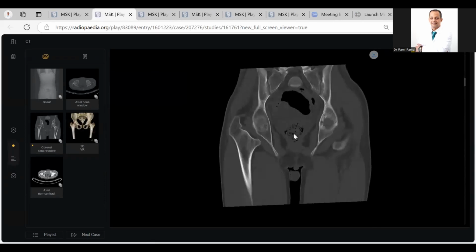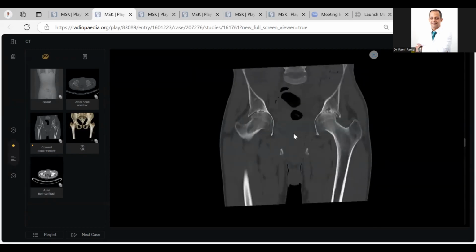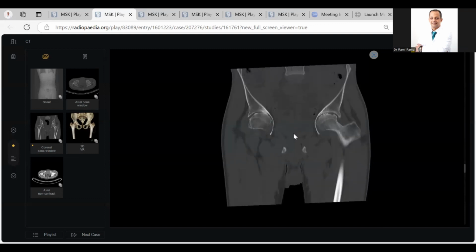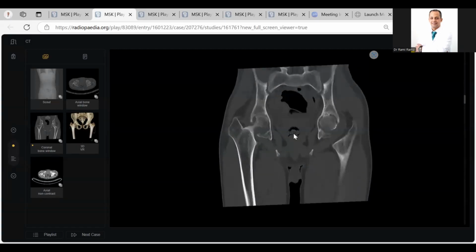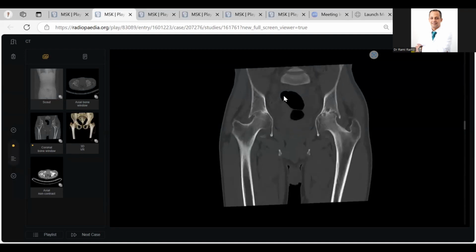This is a case of rheumatoid arthritis. You did it very well. You told me there is narrowing, there is erosion, and you talked very well about the possibility of septic arthritis. The difference of rheumatoid arthritis versus osteoarthritis is that rheumatoid arthritis shows concentric joint space narrowing, but osteoarthritis shows superior joint space narrowing. I'm waiting for you also to look at each pelvis X-ray. You should tell me about the sacroiliac joint, please, please, please.